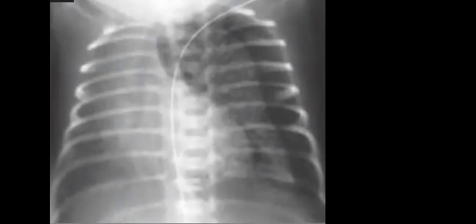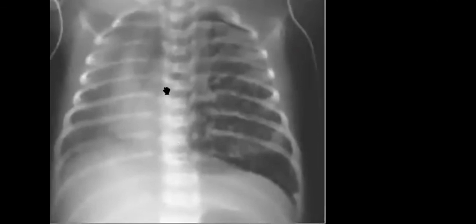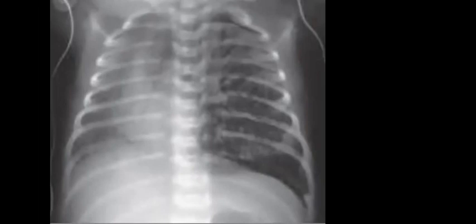Or also there is another example with this patient after he received the ventilation therapy, and you could find maybe some bubbly appearance reaching even the periphery. So this could be interstitial emphysema. So pulmonary interstitial emphysema.